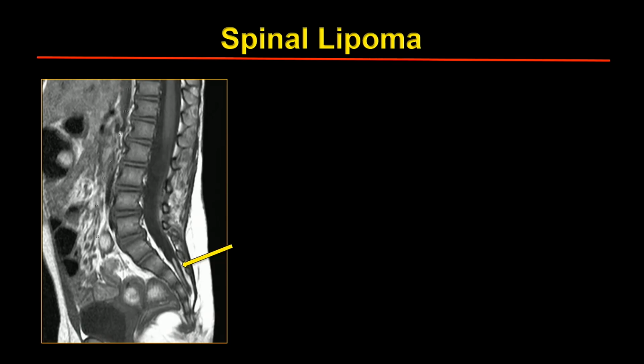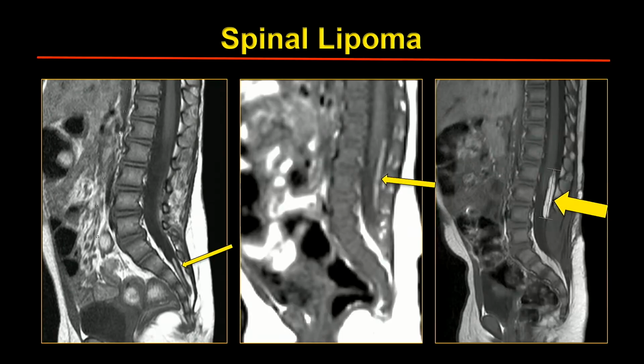Now, the treatment of fatty filum lipoma is surgical untethering, which happens by just sectioning the filum at the level of the conus, and this is how a normal post-op appearance looks like. They don't resect the entire filum, so if you see a little fat, that's completely normal. That's a good response to treatment post-surgery. It's also important to remember that spinal lipomas can significantly increase in size, particularly in the first few years of life, and particularly after first few months of life, because the size and growth is closely correlated with the physiologic growth of subcutaneous fat. So as the subcutaneous fat grows and the BMI grows, the lipoma will grow. So that's why we have to have shorter follow-up in younger kids post-op spinal lipoma.